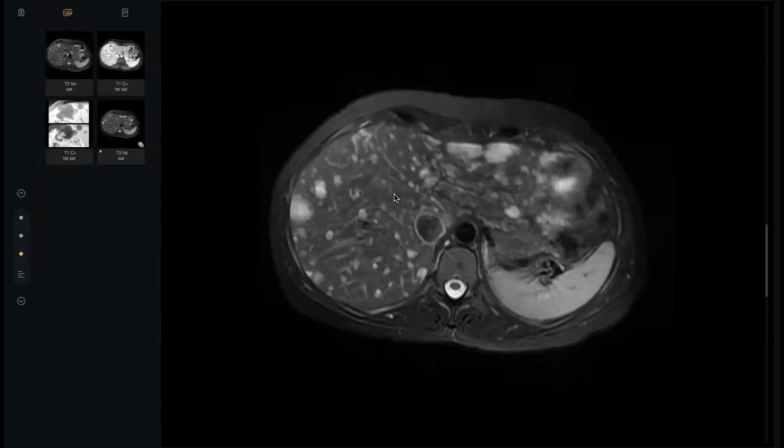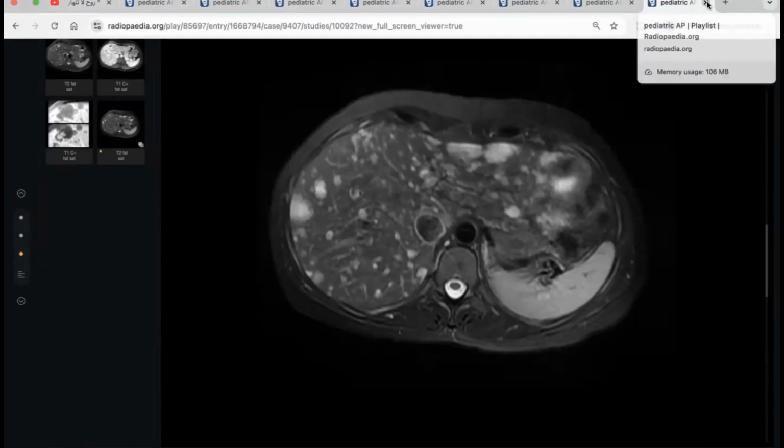Multiple hepatic abscesses. Okay, but clinically the patient is asymptomatic. So, never exclude metastasis and abscesses. The most important buzzword in biliary hamartoma is bizarre shape. Okay, my colleague, next candidate.